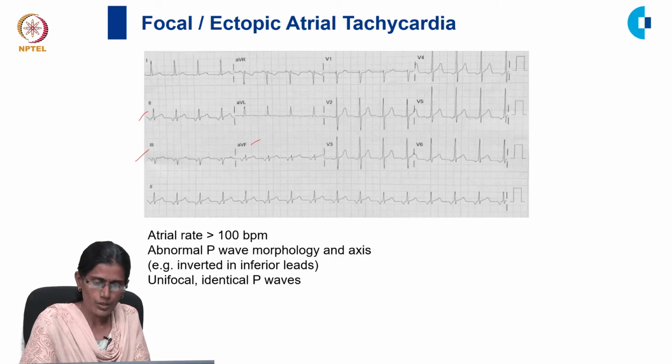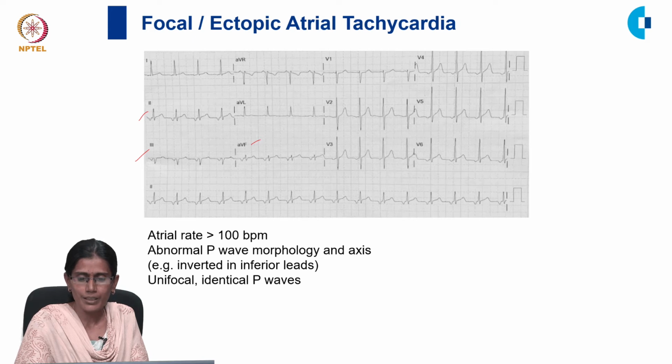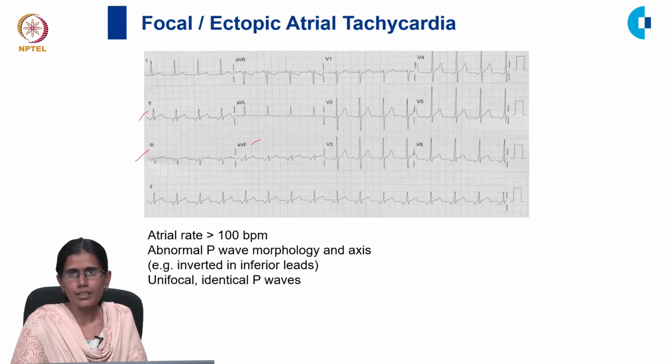But when you look at the rhythm strip, all the P waves are similar. Even though they are inverted, they are similar. It means the impulses start from a single focus.